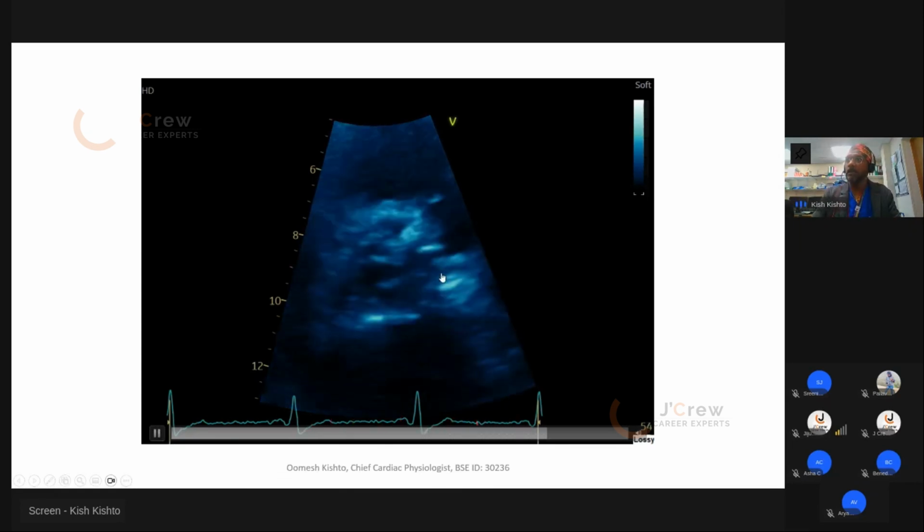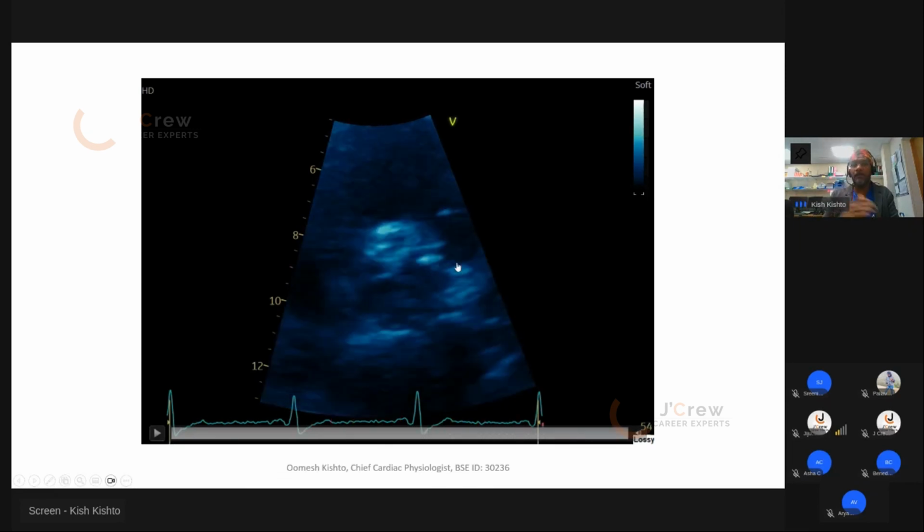So: heavily calcified tricuspid aortic valve with predominantly the right coronary cusp appearing fixed, the non-coronary cusp mildly mobile at the tips with a fixed base, and the left coronary cusp appears fixed.